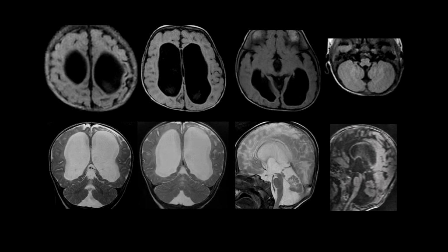Is this an artifact? No, it is real, but I'm thinking, is it gliotic change because of the atrophy also? Where is the hyperintensity on the coronals? The T2, there. Yeah, there's a bit there, and over here. Anterior vermis, yeah.